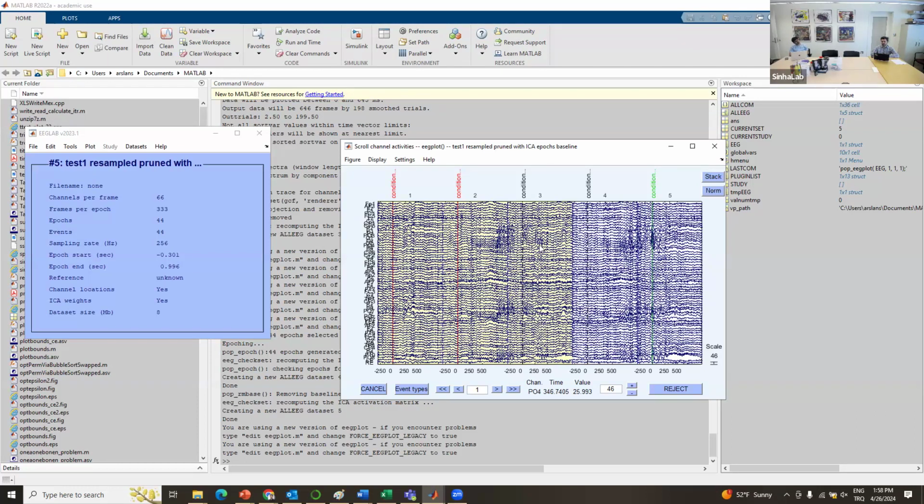Probably in the next session, if we ever have it, I can show you how to do the ERP that I talked about today. Unfortunately, we couldn't have time to do any post-processing, but this is the end of the pre-processing. At least you now know how to do the pre-processing to get these segments of data for later processing stages.